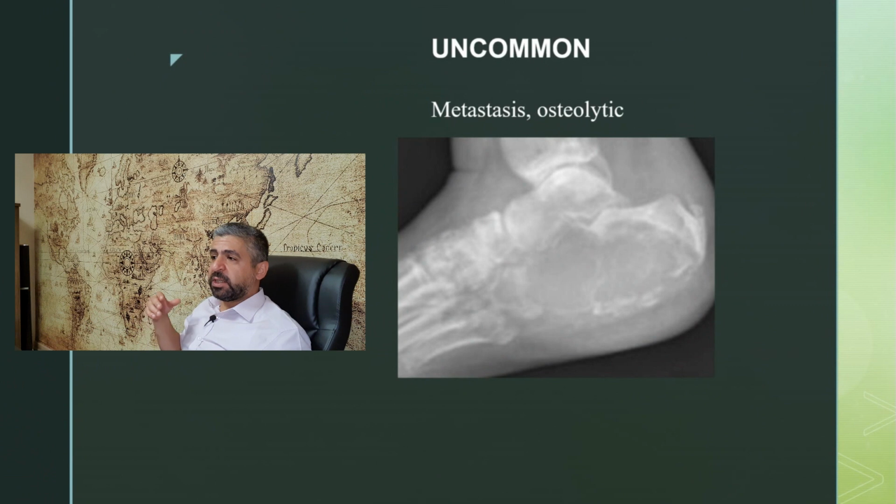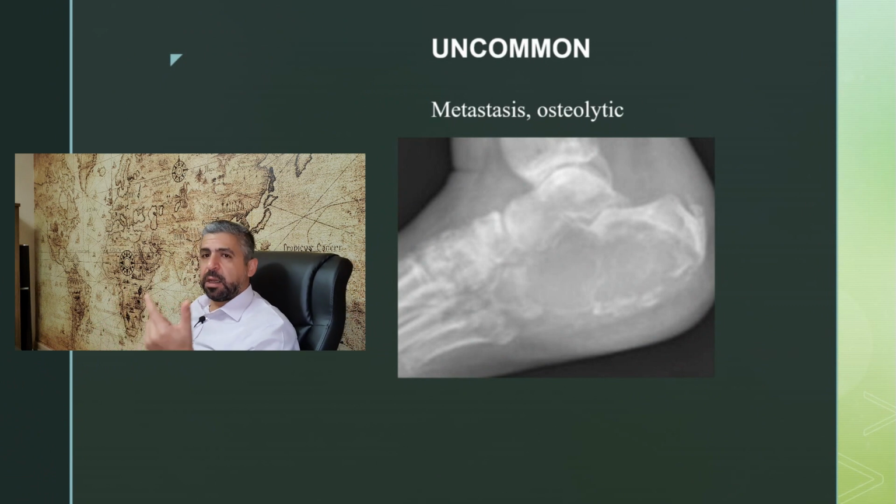Metastases can be seen anywhere in the body. Some places are common, some places are rare. So in the calcaneus, we cannot say there is no metastasis. However, they are uncommon. And if they are hypodense, of course, they are osteolytic metastases.